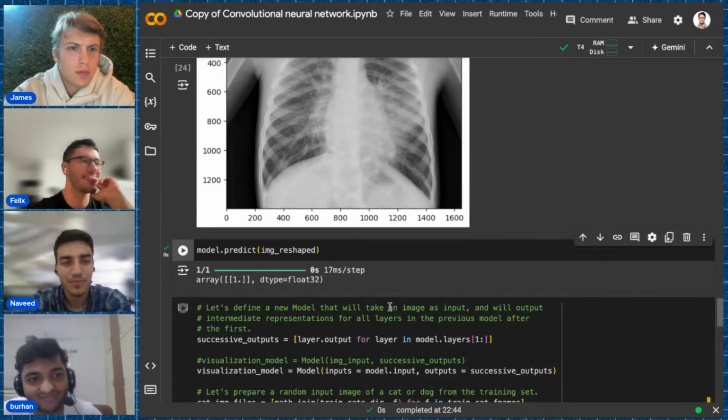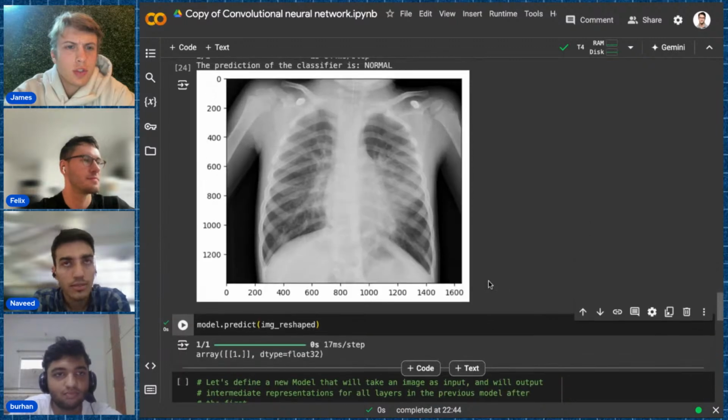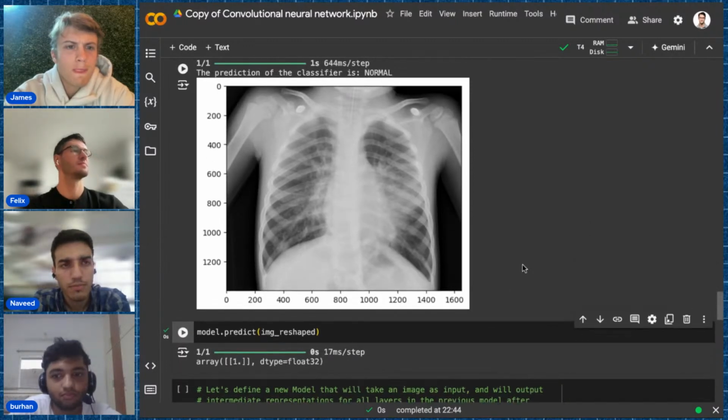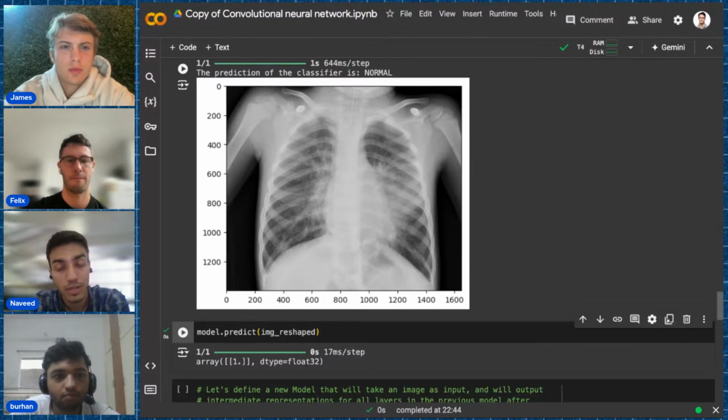That's not a good model. There, that is surely not a good model. Can there be something wrong here? It shouldn't be exactly one, right? It can be. I think there's nothing wrong with the way this is implemented, but the way the model is trained, given the simplicity of the model with the complexity of the task, maybe that could be the reason why this is way off from what the true output should be.